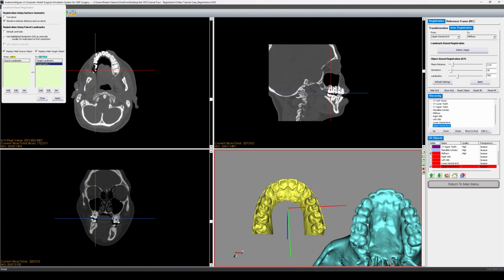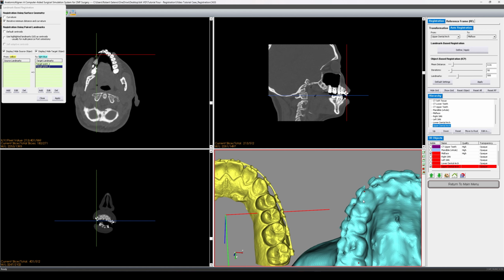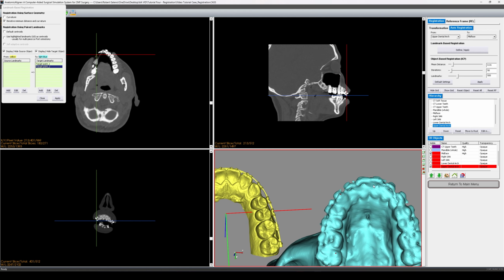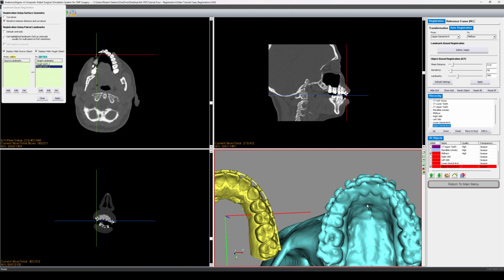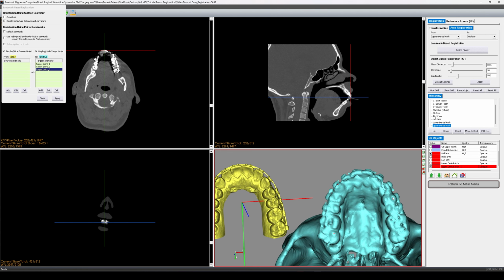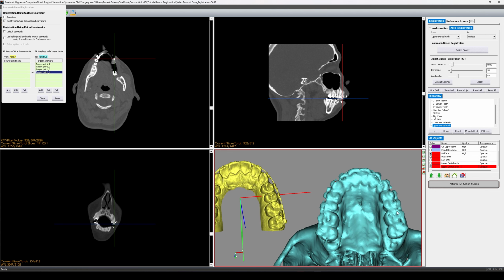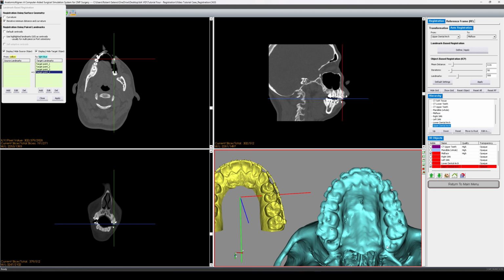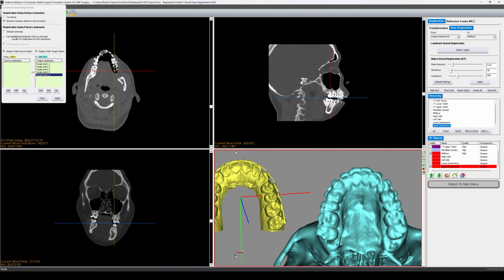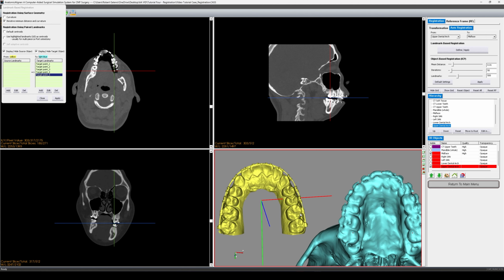That looks good. This canine here is well defined. Looks like the gap between the 2 incisors is pretty well defined. This peak here on that premolar. And now we'll want to match those landmarks placed on the target object and place them on the source object.